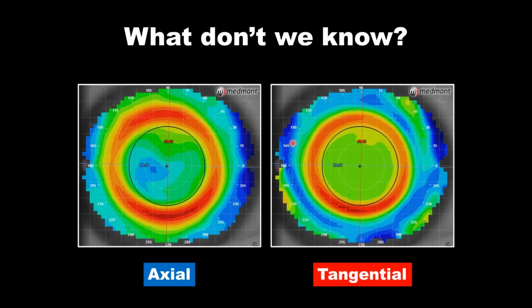Well, part of the problem is that we are using an axial post-treatment and a tangential post-treatment, and we don't know the full story. We don't know what refractive change we created. We don't know what the treatment zone size was. We don't know what the absolute position of the lens was in the closed eye environment. All of these things we learn from something called a subtractive map.